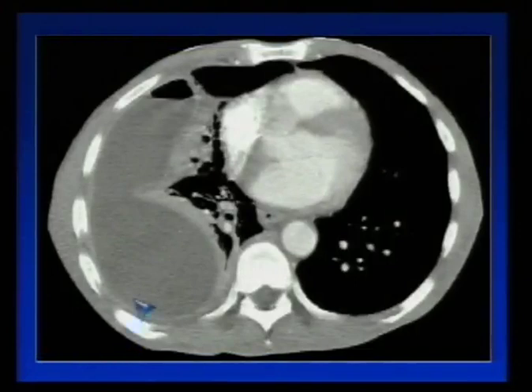And this is what it looks like on the CT. You see how elongated it is? It's lobulated, and maybe it could be loculated, but essentially there's an air fluid level, elongated, and look at the thickened enhancing pleura. That suggests that it is exudative, and this is the split pleural sign. You see the pleura here, and it's split on either side.